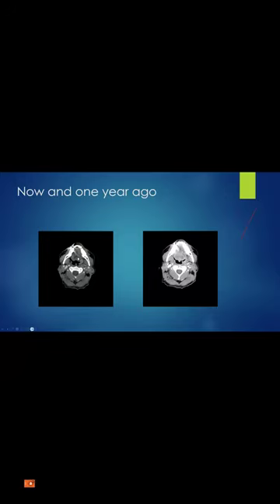Okay, so there is thickening and enhancement in the left glossotonsillar sulcus. Again, another easy to miss finding. Anybody? This is a CT neck.